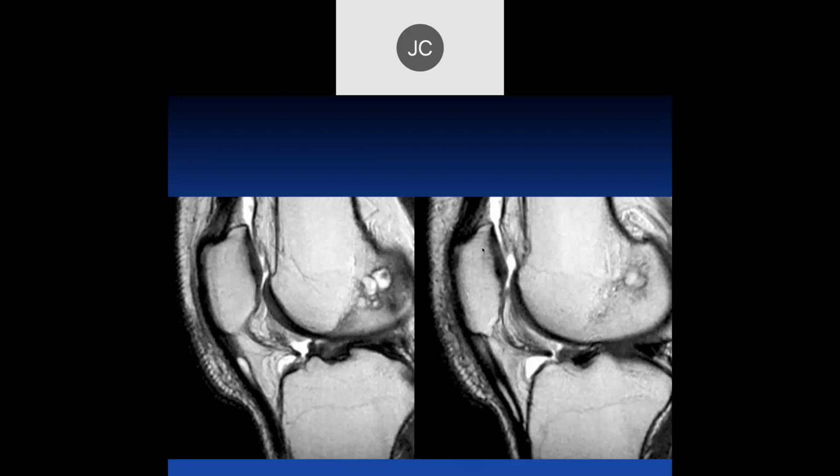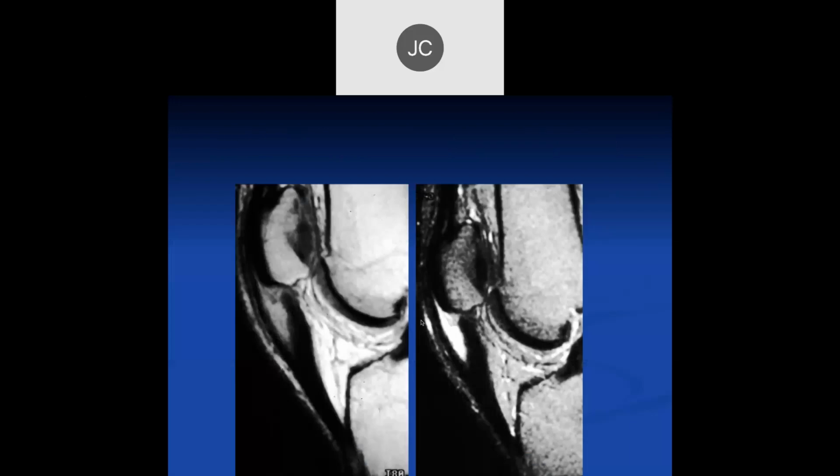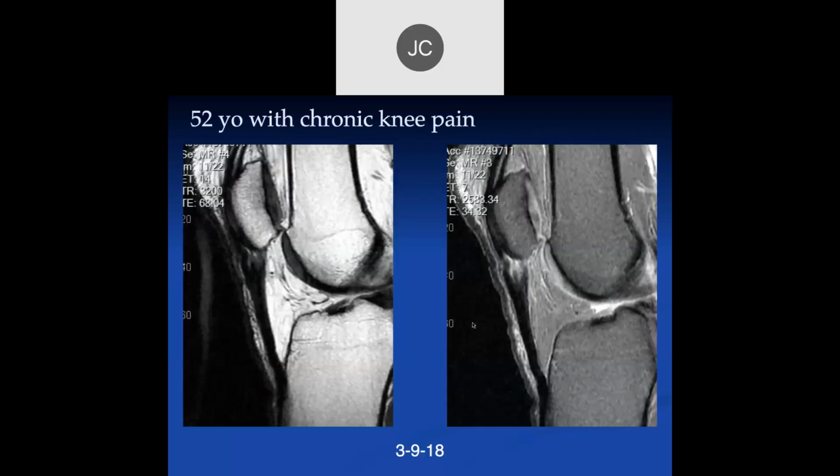All right, so we have tendinosis with intersubstance tearing of the patella. Yeah, right. So this is a partial tear, which we can see here, kind of longitudinal, right? Yeah. And then here's another athlete where we can see a high-grade partial tear, approximately similar to that one that was operated on before. So you can see there.